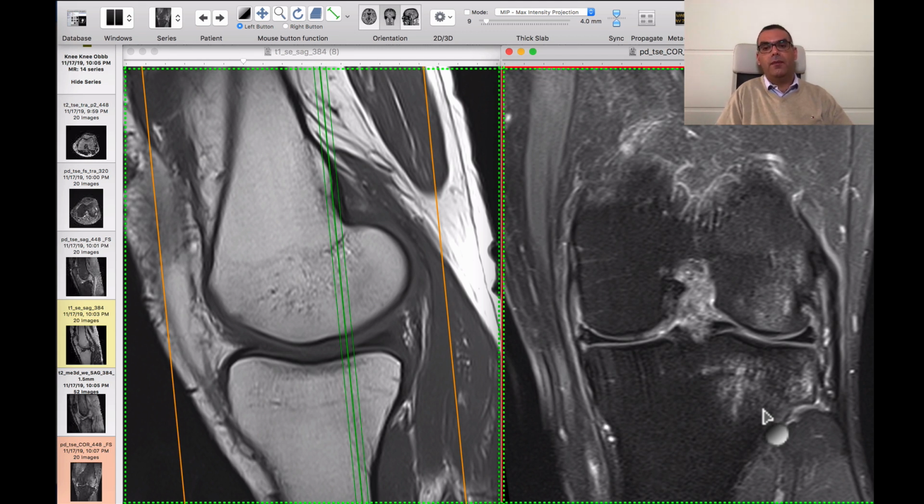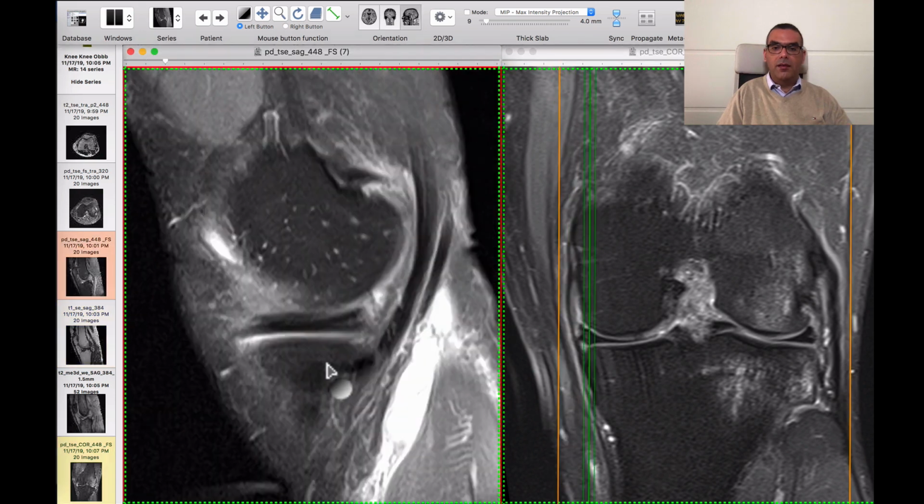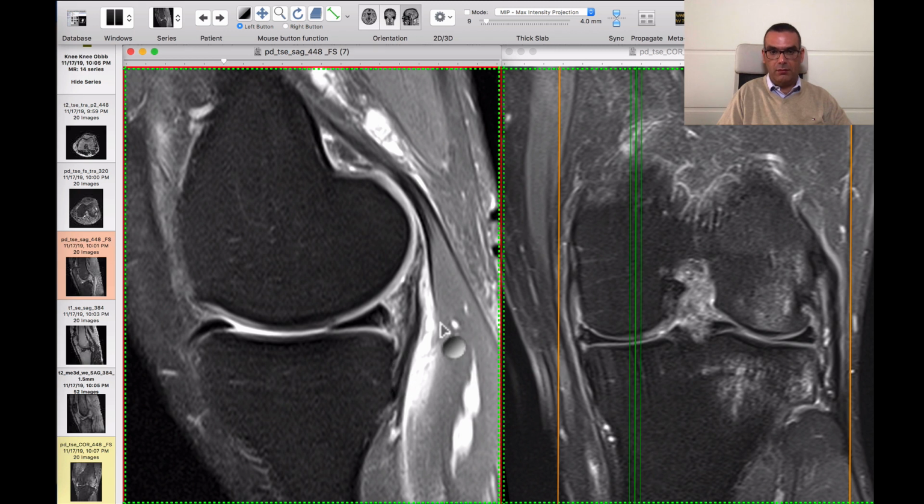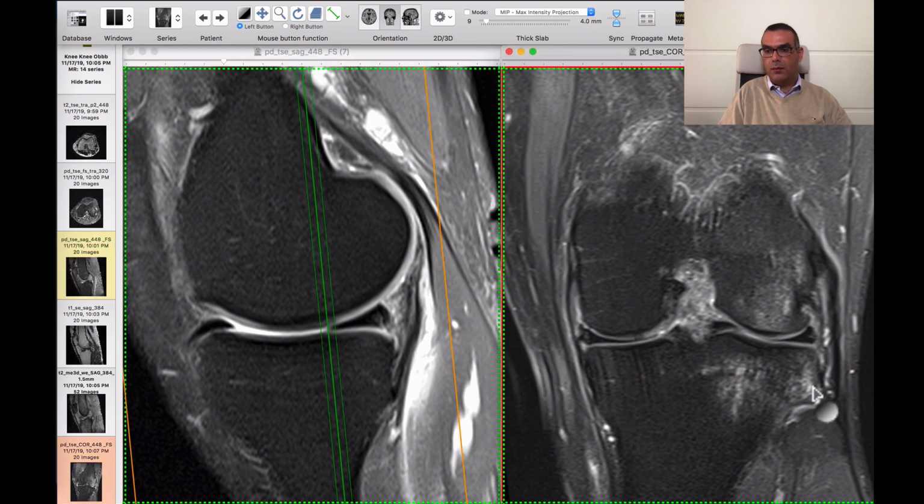When you see an ACL injury, you have to look at the meniscal ramp lesions, make sure if there are any of them obvious, and when you see the marrow contusions at the posterolateral corner, make sure that the posterolateral corner structures are intact. From the bone, the trabecular compression fractures, the arcuate ligament, the popliteofibular ligament, and the lateral collateral ligament. Each of these structures, you have to be very meticulous in identification of their pathology.